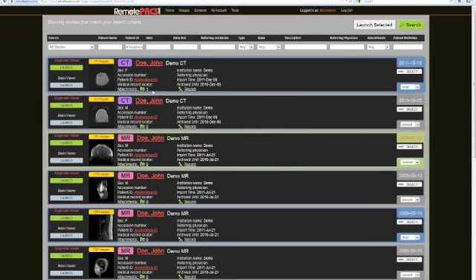The more documents you add, the higher this little number will go, indicating to people that there are, in fact, documents for this particular study. Also, some radiologists don't want to read a study if there isn't paperwork already attached to an exam. So we've given you up here the ability to search for only studies that have documents attached. That way they don't have to waste their time looking at things if there's no patient involved.